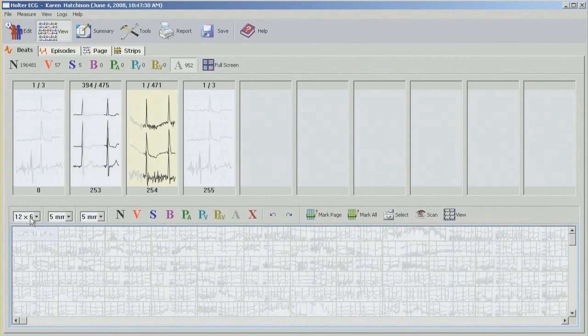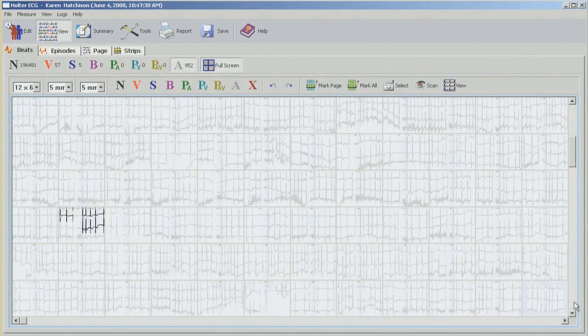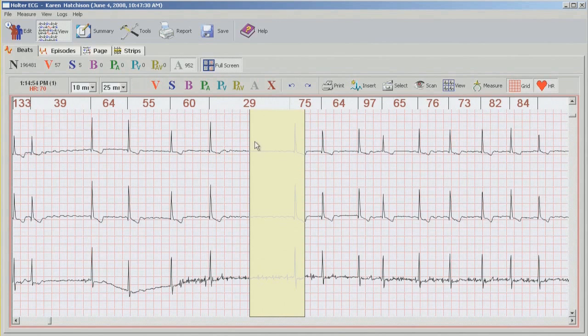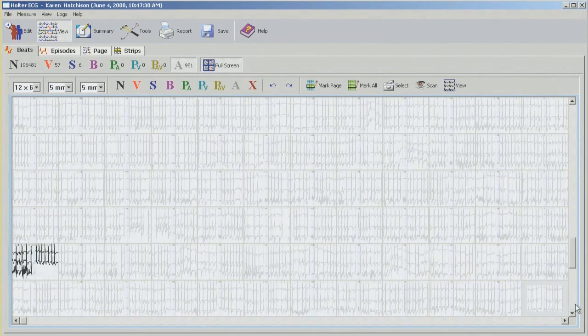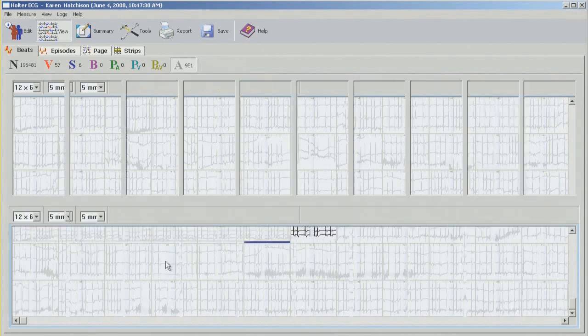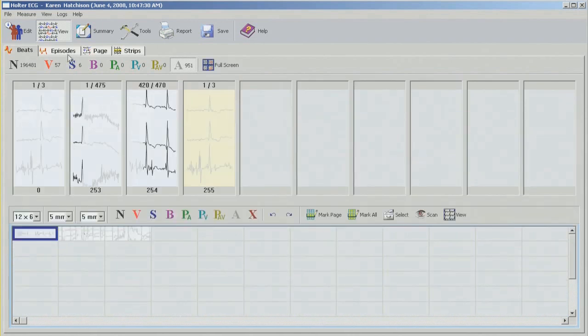And moving on to bin number 3. And we'll look at this one and change this to normal. And the last bin, only 3 characters, and I can see there's just a mess here, so I don't need to go into any details. So we finished editing through all the beats right now. The next move is to go into episodes, since we're working left to right.